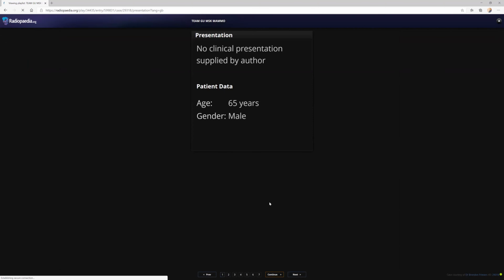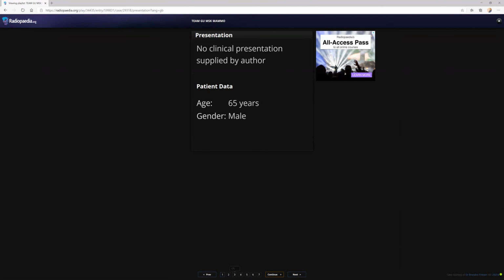Okay. And one more thing, because sometimes the vertebral foramina are involved. Your case is over, so you have to take another case. Okay.